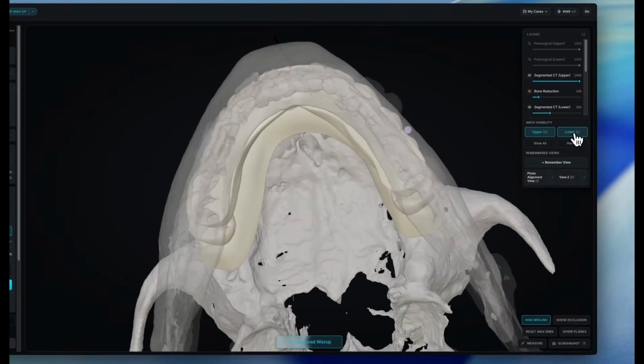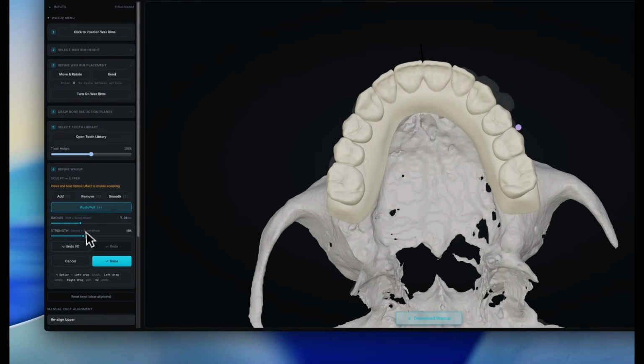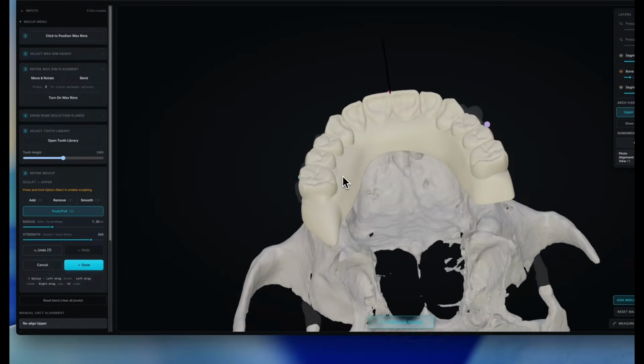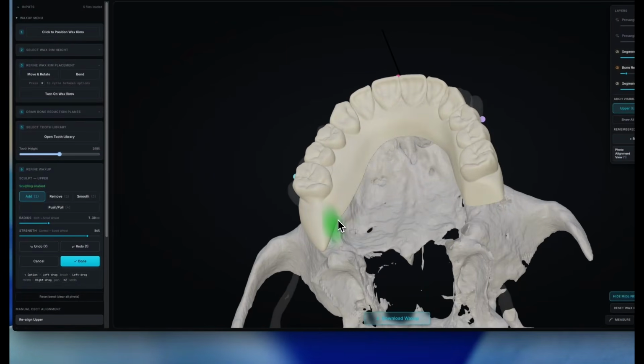One more thing I want to show you guys, whoever's doing pterygoids, this is an amazing way to plan things to the patient's anatomy. I'm using the push and pull here, and I'm just gonna click and pull. And this drags our pterygoid extension exactly to where I'm gonna be planning to place my pterygoid implant.